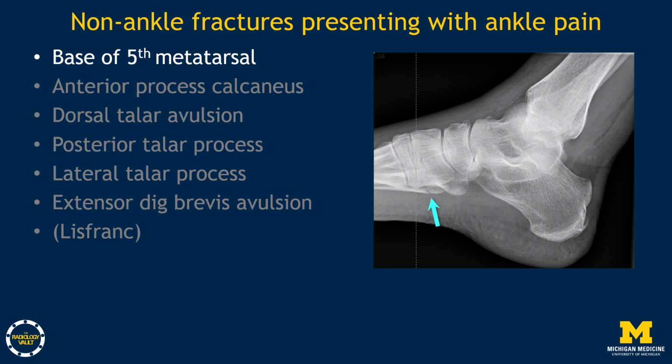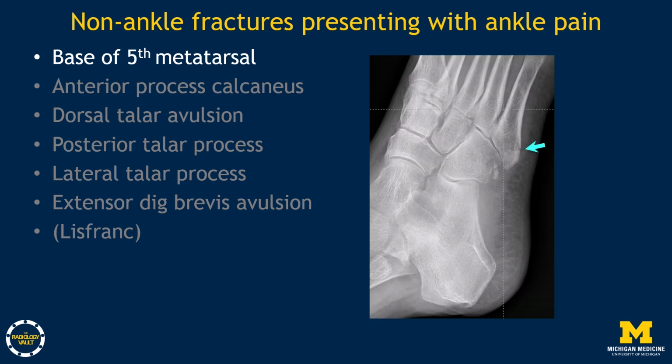Fractures of the base of the fifth metatarsal are so common that conventional lateral ankle radiographs should always include the metatarsal bases. Here is one example of this fracture. Fractures of the fifth metatarsal base are easier to see on oblique views of the foot.